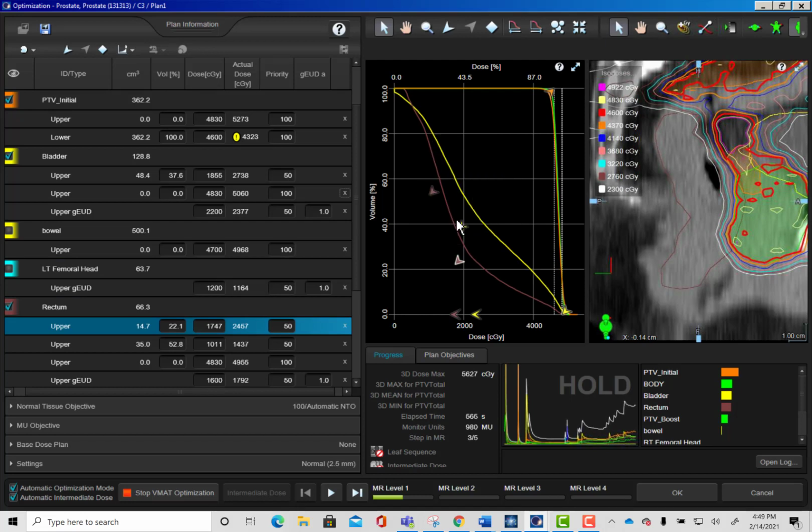If we look at these, so this one is 10%, the cost is 10%, so that constraint is working pretty hard, but like this one's 5, this one's 3, so I don't know, at some point I kind of stop dragging them back, and I will just up this number, see if it'll push any harder.